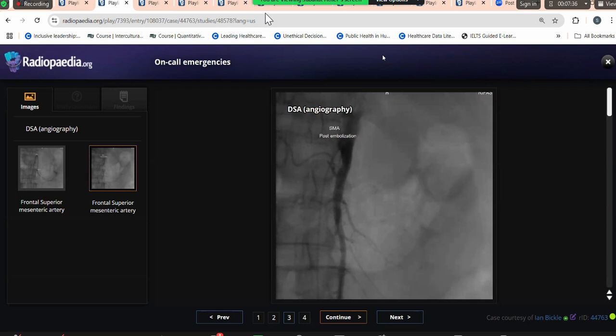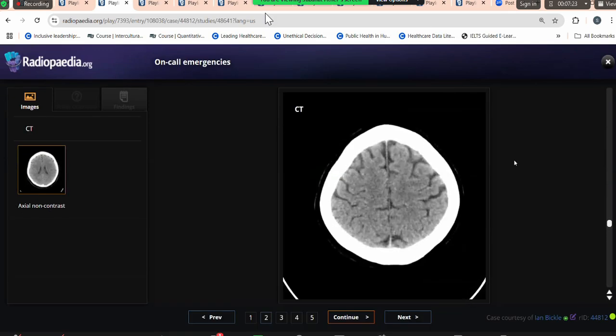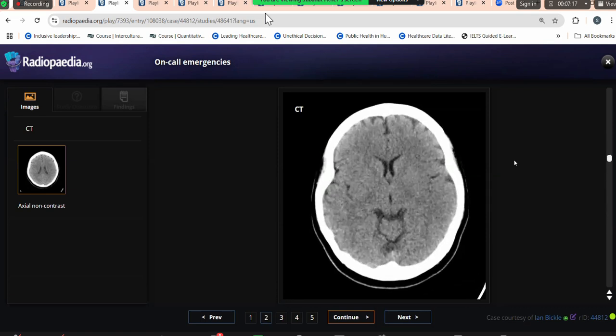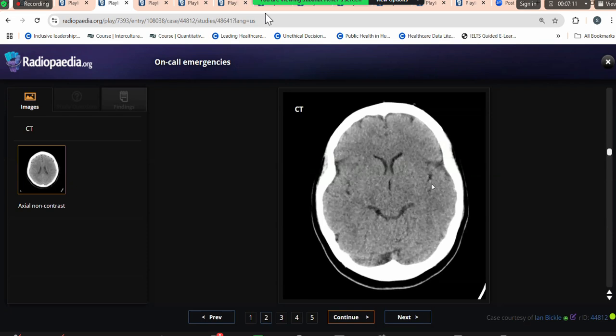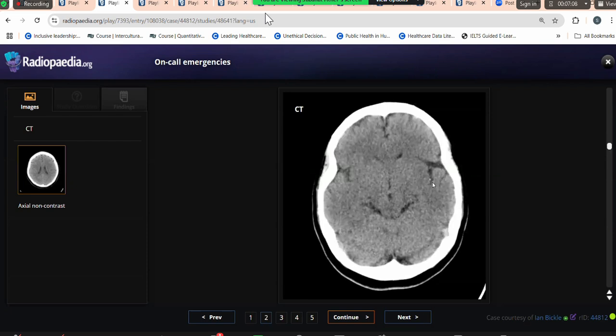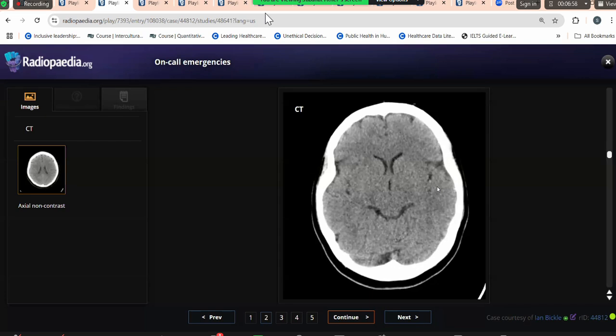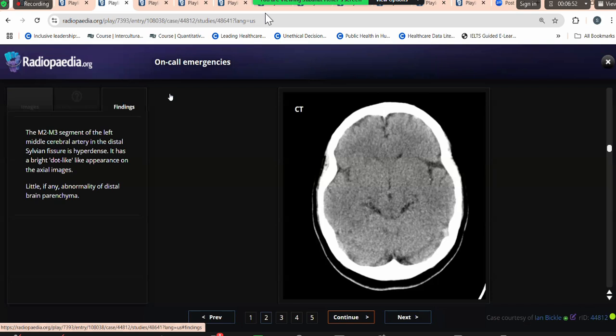Okay. Now this one, yeah, this one was a tough one. This CT abdomen, this CT brain, I do realize was a tough one, but that is why I was constantly giving hints to the candidate that the patient has neurological deficit on the right side. So if you would bear with me, can you see the extra-axial CSF spaces, the Sylvian fissure on the other side? So this is the MCA dot sign here, very subtle. I will not be very surprised if it's difficult to see, but retrospectively, now you can appreciate that there is a left-sided MCA dot sign, okay?